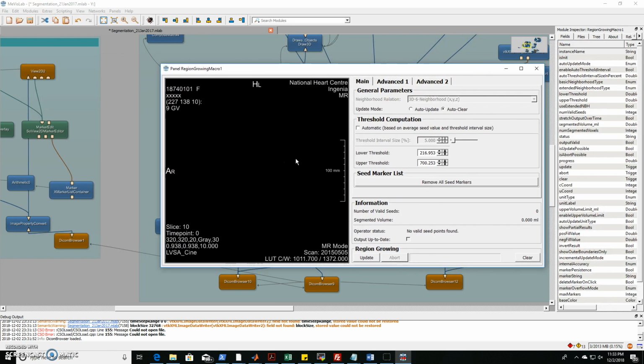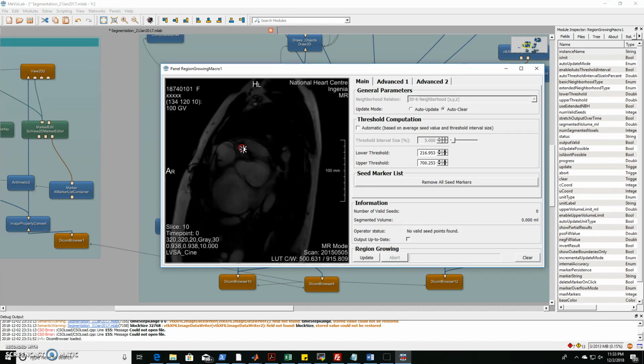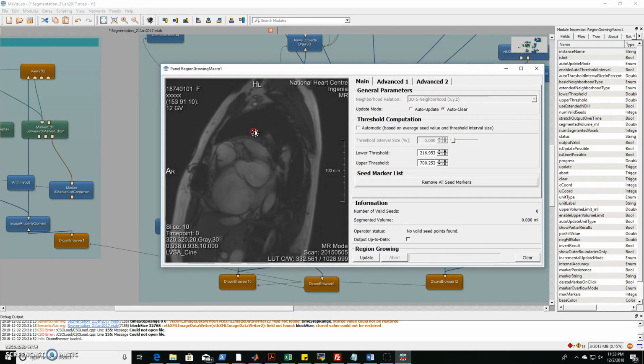At this point in the video, I'm going to share the shortcuts and how to navigate throughout the MRI image. As you can see, as of right now, it's just a black image. But if we right click and drag our mouse over, you can change the brightness, and you can find a brightness that's sufficient to use. I usually like to go about right here. Once you have that, you can see our heart.